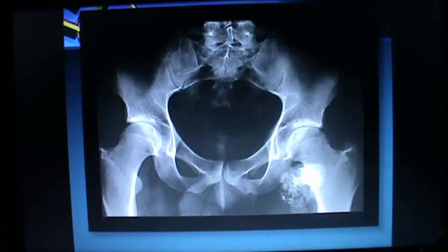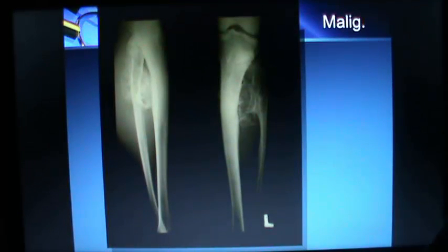It's another lesion. Here we can notice that the soft tissue around is dense on the lateral view image, and density of the tissue, rapid growth, warming of the skin, dilated veins, change of the rate of growth, all should direct your attention to malignant transformation.